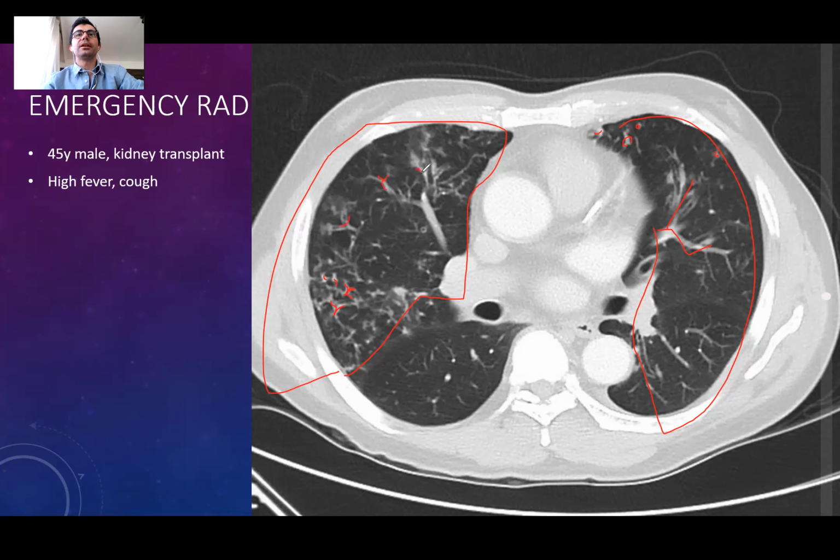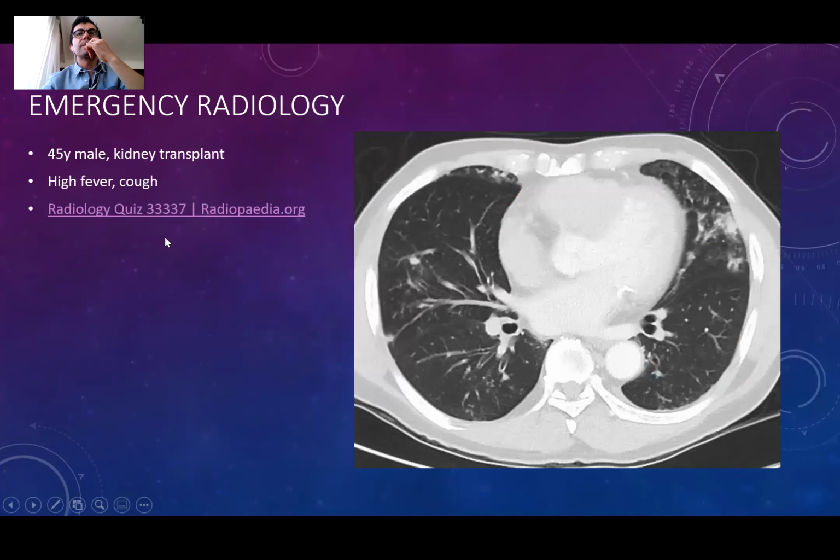What can be our pre-diagnosis for this patient? I'm seeing some abnormality on only some part of the lung, right? So the disease we are talking about should be some focal infiltration area. What can it be? Pneumonia. Pneumonia in a kidney transplant patient, who is probably getting immunosuppressants, right? So yeah, let's move on.